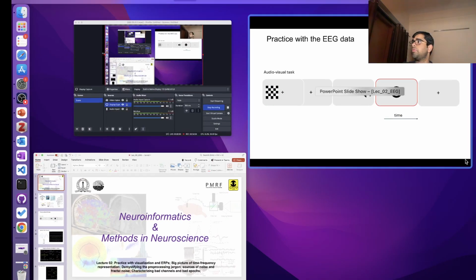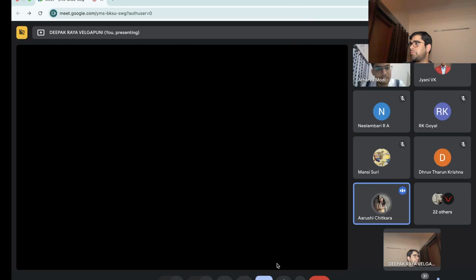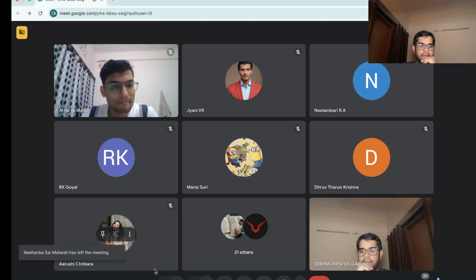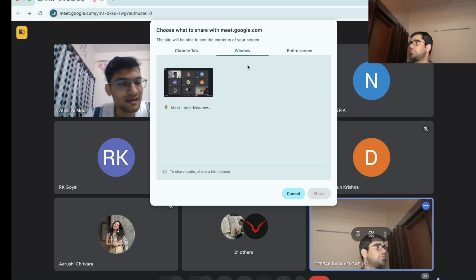So I tried using just the right hemisphere electrodes 49 to 52. That shows a better graph of just the... Oh, nice. Yeah, great.